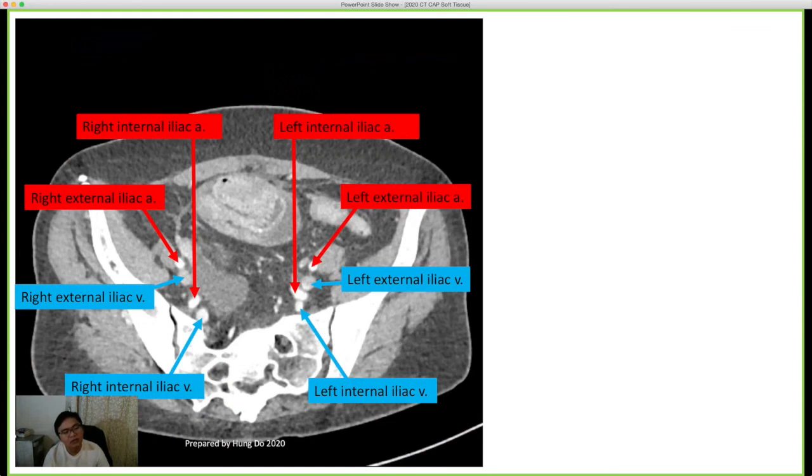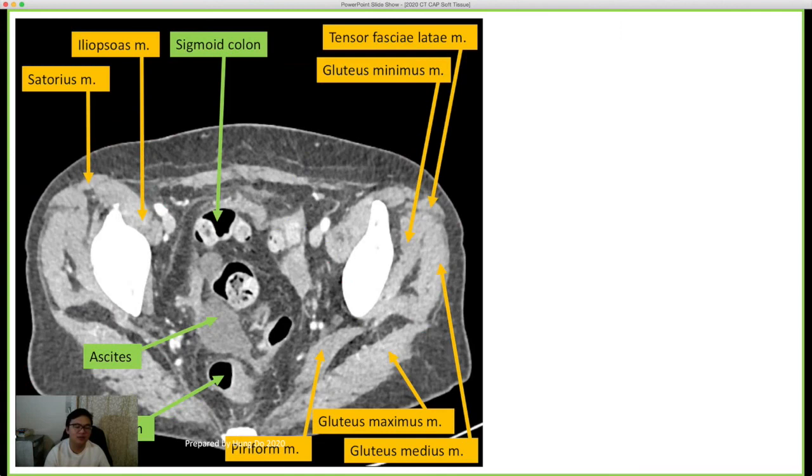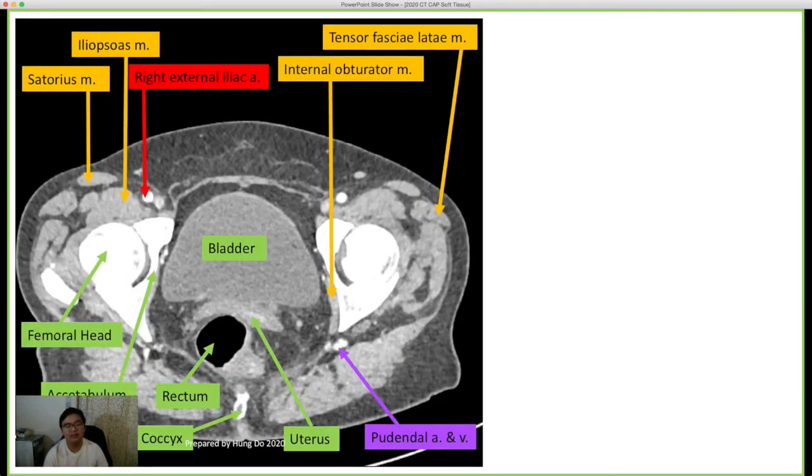Sorry, my apologies. This is not the uterus. I don't know why I called it the uterus. The thing in the middle here is a loop of bowel that has come on itself like this. My sincerest apologies. Now if you think about it, the uterus shouldn't be that high anyway. So a lot further down here is the uterus.